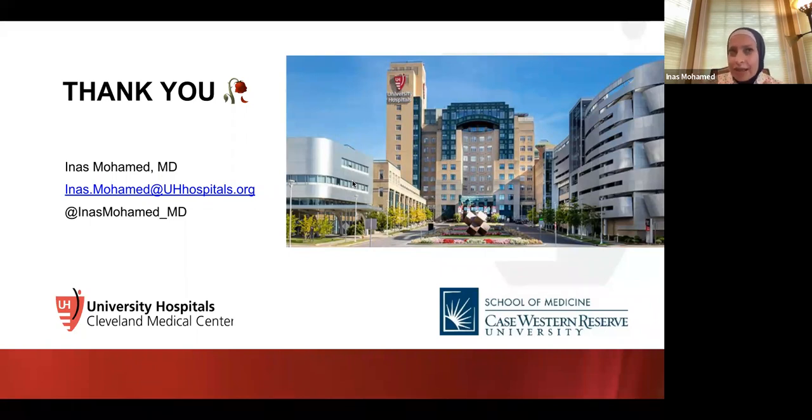Another thing I want to tell you: a mass that big and no intrahepatic biliary dilation is extremely rare. If you have a cholangiocarcinoma that big and the bile ducts are perfect, it's kind of like, no, I wouldn't go there. I wouldn't go for cholangiocarcinoma.